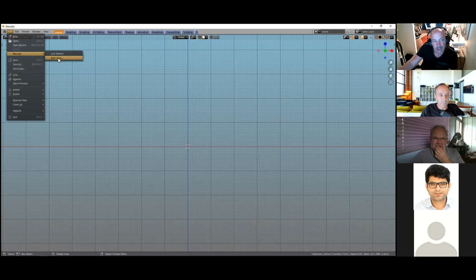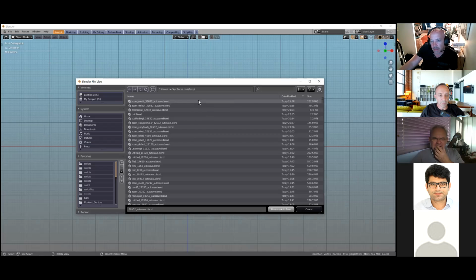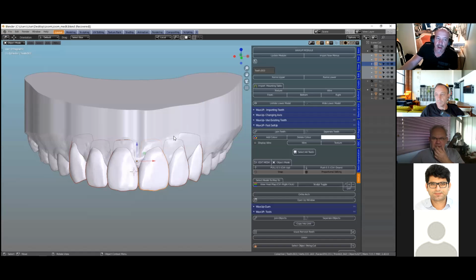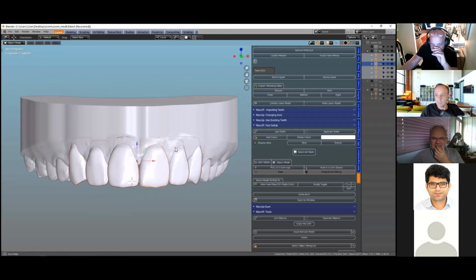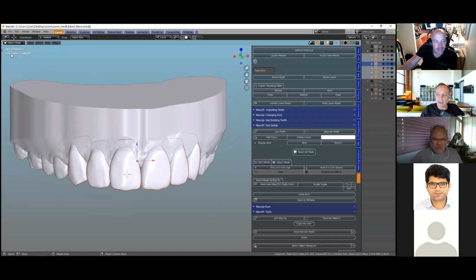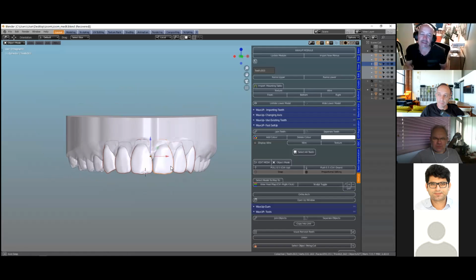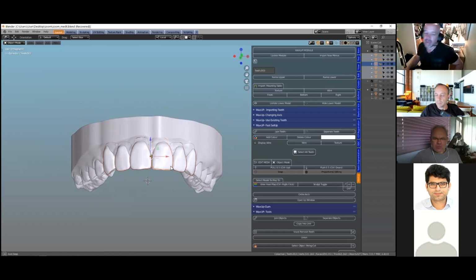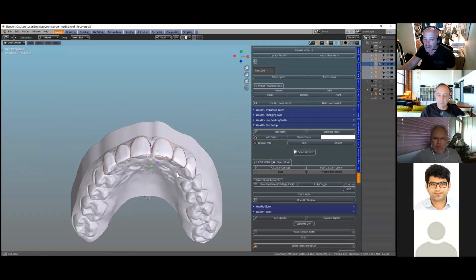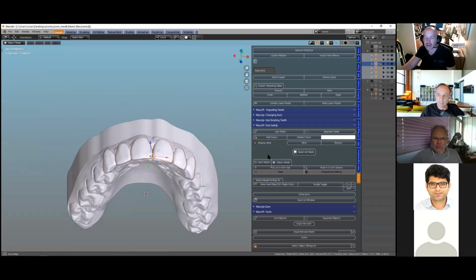This is exactly, yeah, thank goodness. For you guys that don't know how that works, it's a lifesaver sometimes. So autosave: file, recover, auto save. And you can set your Blender to various times. You can save it every 2 minutes or whatever you want. So, wow, okay.